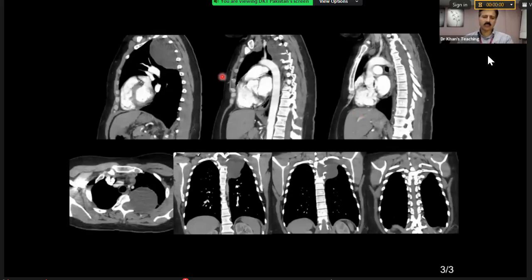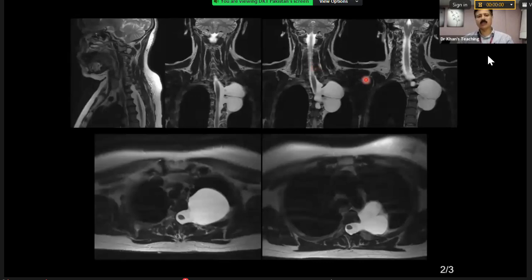Now, on the CT, it tells you what can happen and how. There is posterior scalloping. All of this is scalloped. And you can see on this coronal or this sagittal how the ribs are splayed, etc. On an MR, it then becomes clear that this is completely cystic and this is simple, we call it lateral meningocele. This is simple dural ectasia. So the same thing, because it was so big, it was confusing us. And there is scoliosis also.